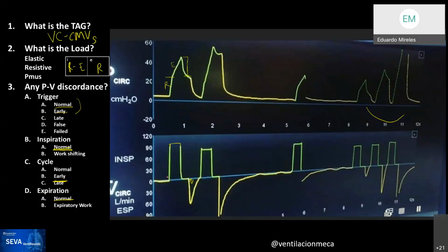And then what happened is probably the prior breath over here was one of these breaths, and so it got the same amount of flow, thinking because it doesn't do it in intra breath. I think it does it after the next breath. It gives you the same to maintain that, and because there's varying, oscillating amounts of compliance changes because the patient is air trapping, it's creating these different levels of flow compensation being delivered.